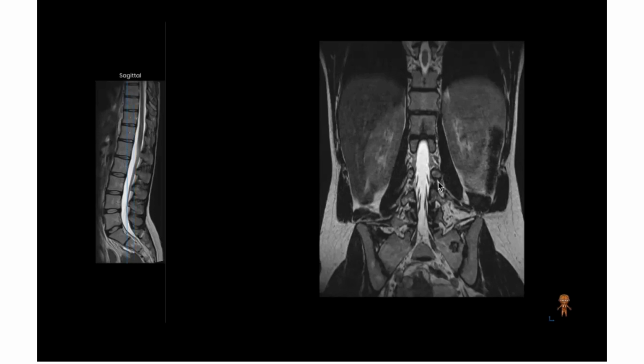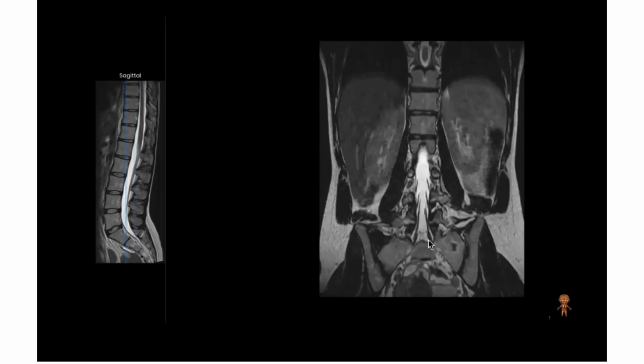And nowadays, when we do endoscopic discectomies, it is again very important for us. Especially for the L5S1, L4-L5 region, when there's extrusion of the disc or sequestration of disc, we want to see, when we go interlaminar, from the posterior side, what is the safest route to enter.